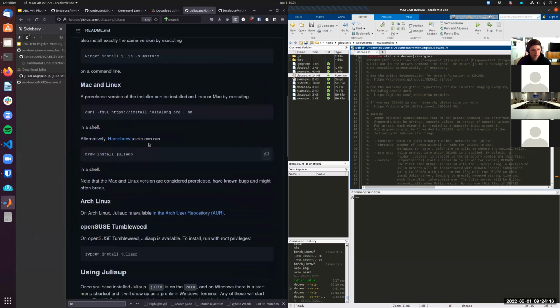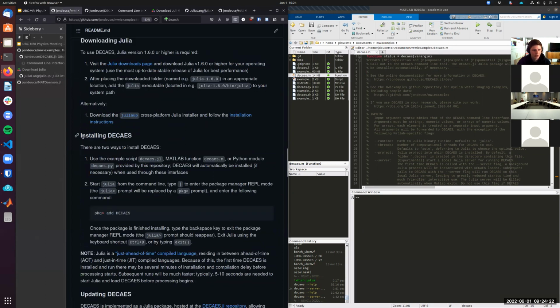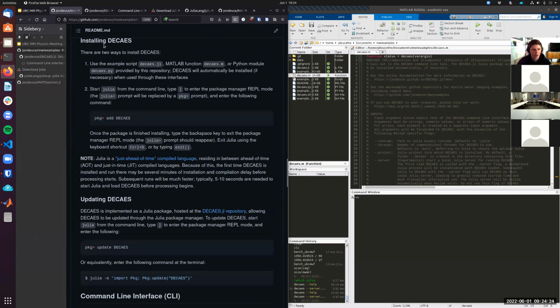So where am I here? Just going back to, what step am I on? Okay, downloading Julia, we've done that. Installing decaes. Technically, we're doing this first one. So if you use either this script, decaes.m, or the Python module, decaes will be automatically installed for you. Okay, so this part we're not going to do because we won't need to. We can do that later when we do the command line interface.